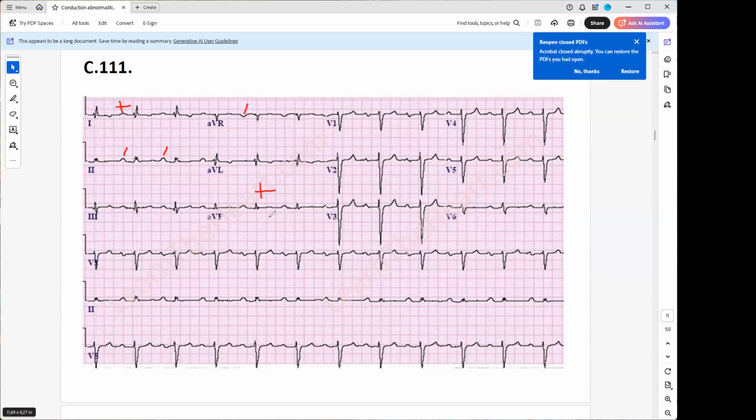And then for the diagnosis, I think it's a first degree AV block because every P wave gets conducted, but very slowly. So the PR intervals are prolonged. And I would also say that we have an RSR. Yeah, this is nothing. This is not a bundle branch block. That's some kind of intraventricular conduction delay or changes, but it's not a right bundle branch block.